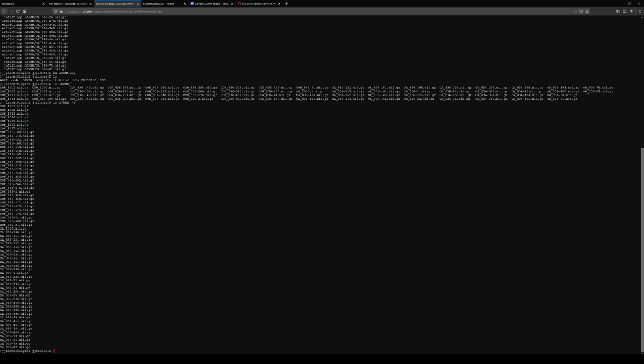And by convention, the control group goes first. And so whatever you need to do to name the files, if you're setting this up on your own, just put the control group first. You don't have to, but if you do, then it's consistent for every analysis you do. And so then when you're trying to interpret results, you know what the results are and really how to interpret them, which group has what difference.